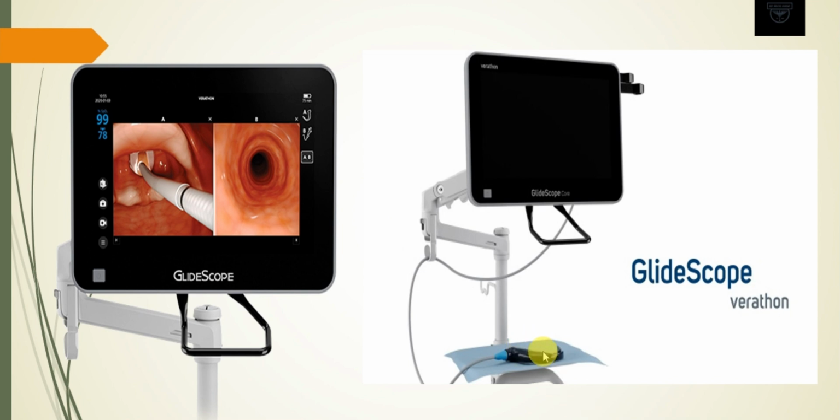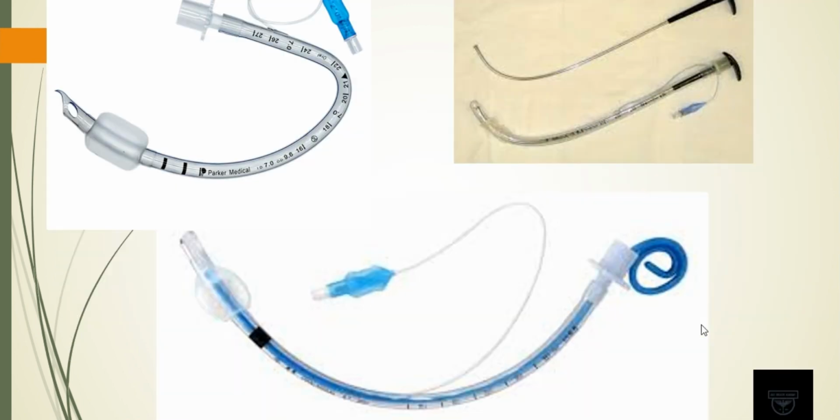You just use a glide scope here, you attach it to the device. So the scope is here, the device is here with this connection. Sometimes if this is disconnected or not placed in properly, you won't get the visual, so you have to make sure it's well connected. Put the scope in, you look here, and then you pass it through the cords. You take the stylet out, and then you inflate the bulb and start bagging your patient.